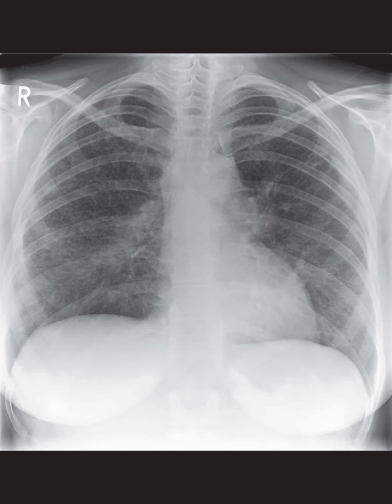Sarcoidosis, as you might know, is a bit of a tricky condition because it can affect so many different parts of the body. When it shows up in the lungs, we often see bilateral hilar and right paratracheal lymphadenopathy. In this case, the findings are pretty classic for sarcoidosis, but of course we need to dig a bit deeper.